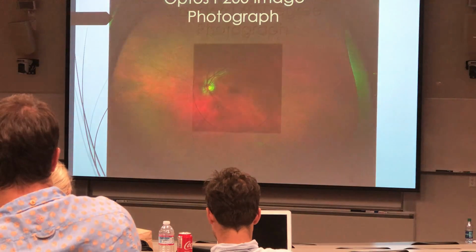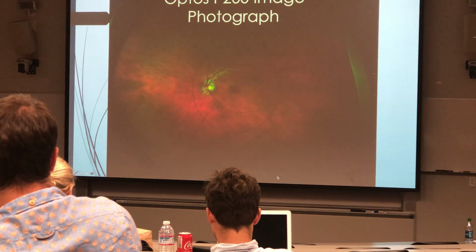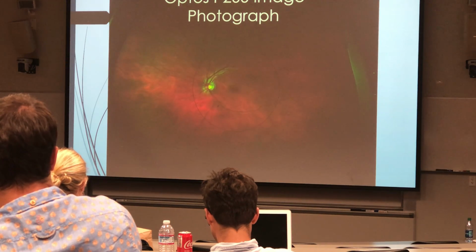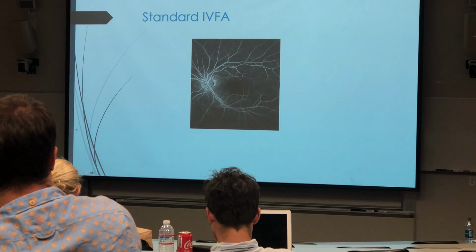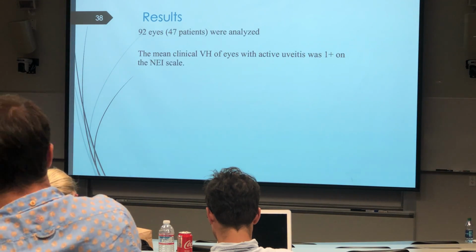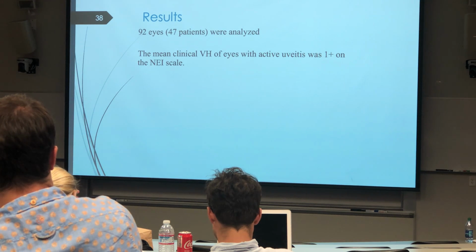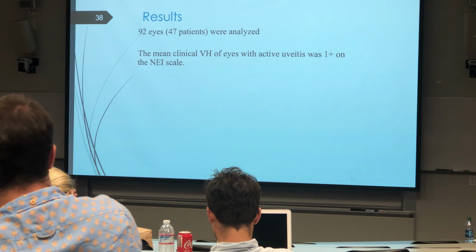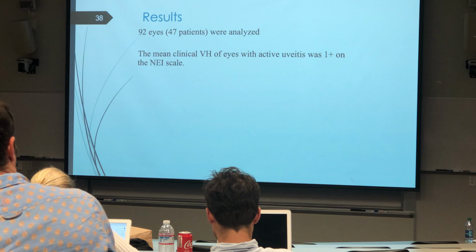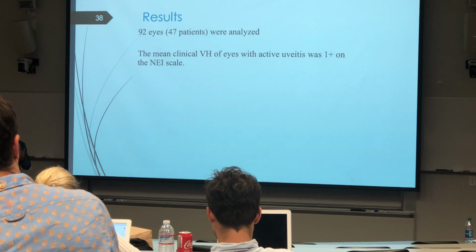So another question that we wanted to ask was, hold on, my slide. So when we saw this, the vitreous, now that wide-angle imaging has started taking over, the issue was, can we detect vitreous haze on these wide-angle imaging systems? Because these are built differently. These are basically scanning laser ophthalmoscopes, and they're actually just 2 lasers in there.